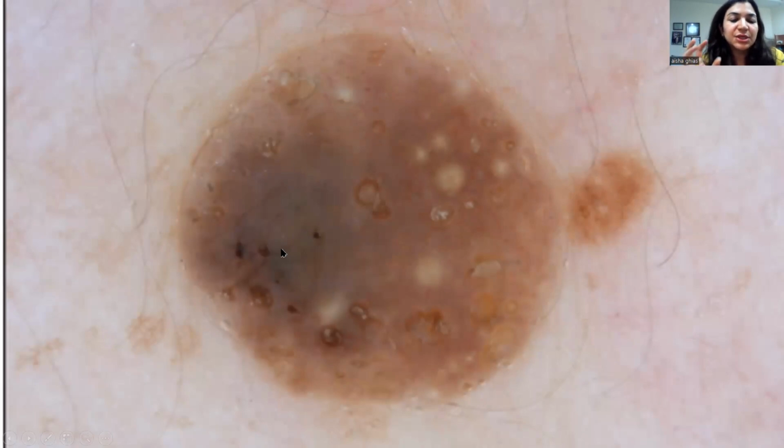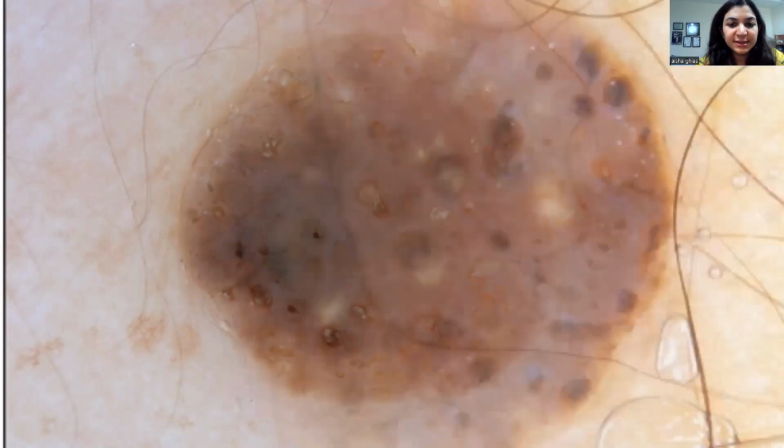Obviously, seborrheic keratosis में there is lots and lots of proliferation of the keratinocytes going on, और उस वजह से जो deeper down होंगे melanocytes वो आपको थोड़ा सा grayish color देंगे. They are situated deeply in the dermis, and as we discussed in the initial part of the presentation, the melanin which has gone deeper into the dermis gives you grayish or a bluish color. So this stays in the normality, and if you come across such lesions, you just don't have to waste your time or go analytical about it. Just say that this is an SK.